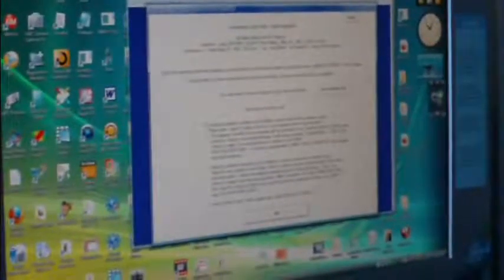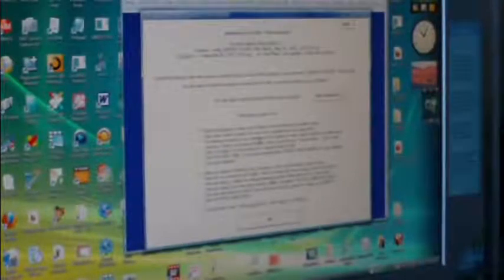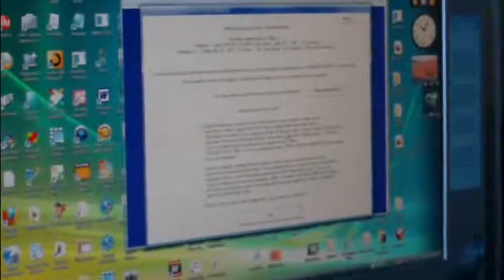Now, the scenarios in which you will make one or the other of these two first choices are as follows. If you don't have any data in this computer, and there is data at the Internet Data Storage location, then the data set that you choose to be the current one is indeed the one at the Internet Data Storage location. That's the case that we're looking at right now.